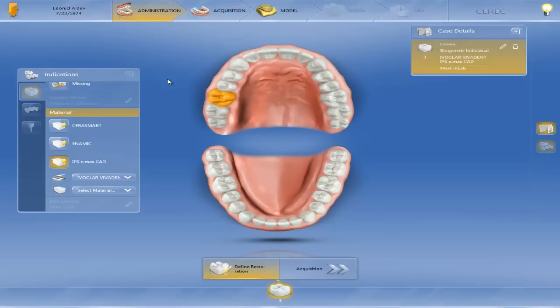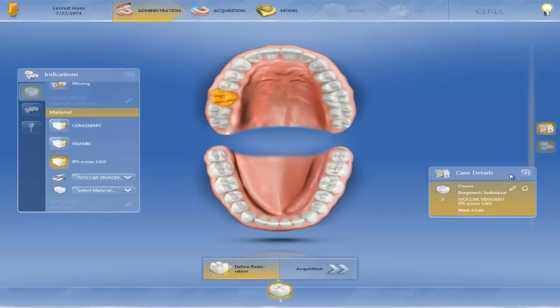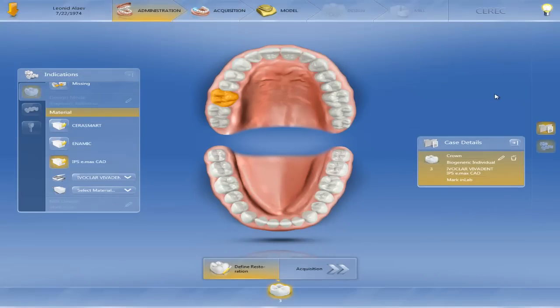What's the difference between 4.4 and 4.3? These small screens and pop-ups are going to stay in the same position on the future case. So it's saving the same position. You can customize it and put it in different places as you want. Let's try this. When I put the cursor on this small tab right here, you can see the hand. But if I go further up here on the top, you see the sign change. With this sign you can move the pop-up to different places, and again it will remember the position, so when you open the next case it's going to stay here again.